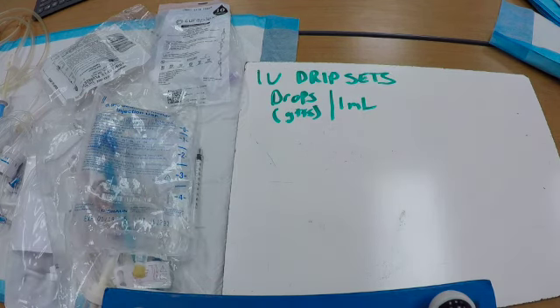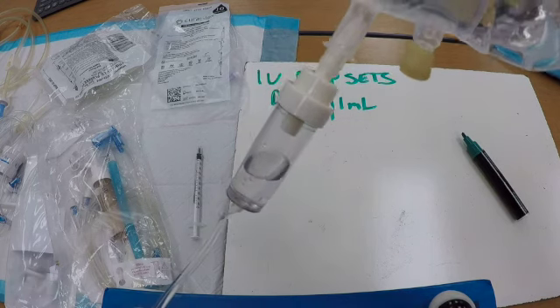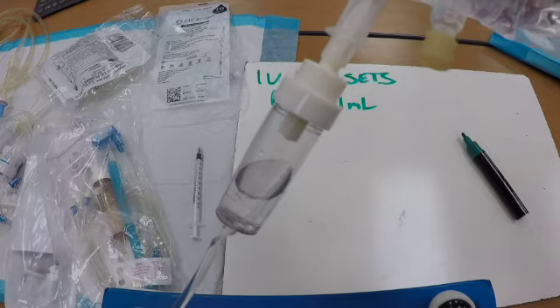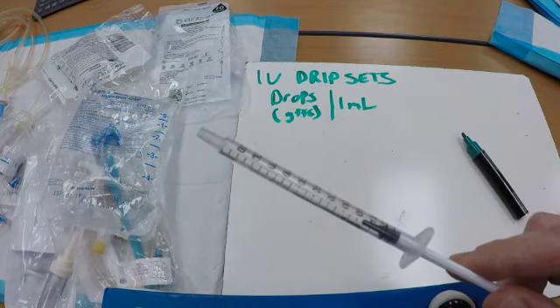So, I'm just going to show this again. Each of these drops, how many of those drops that are flowing are needed to make 1 milliliter.